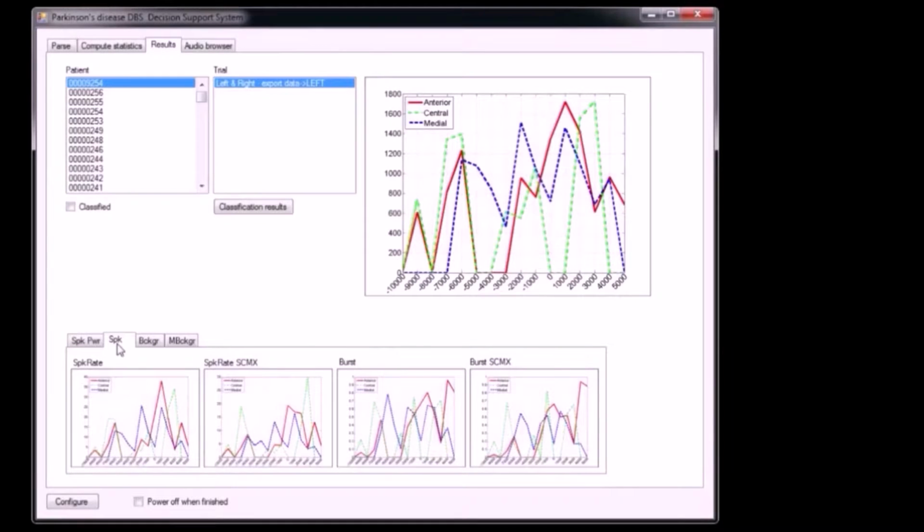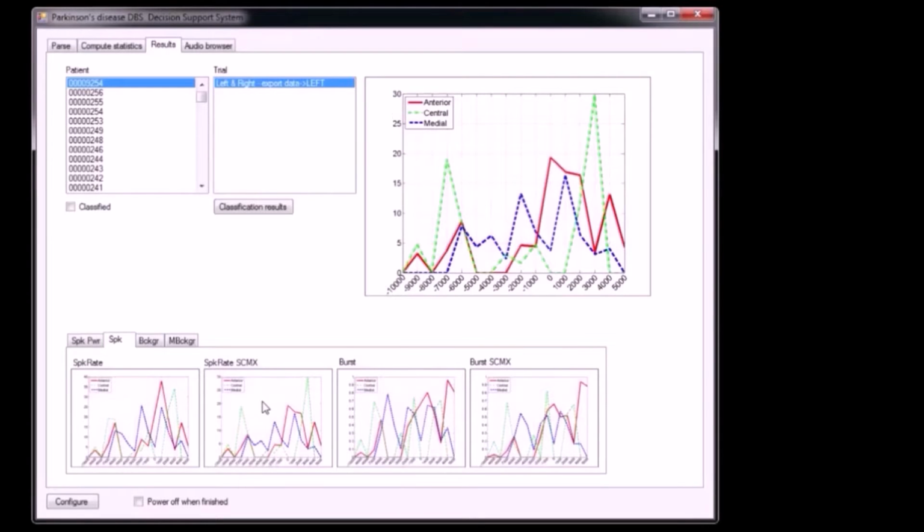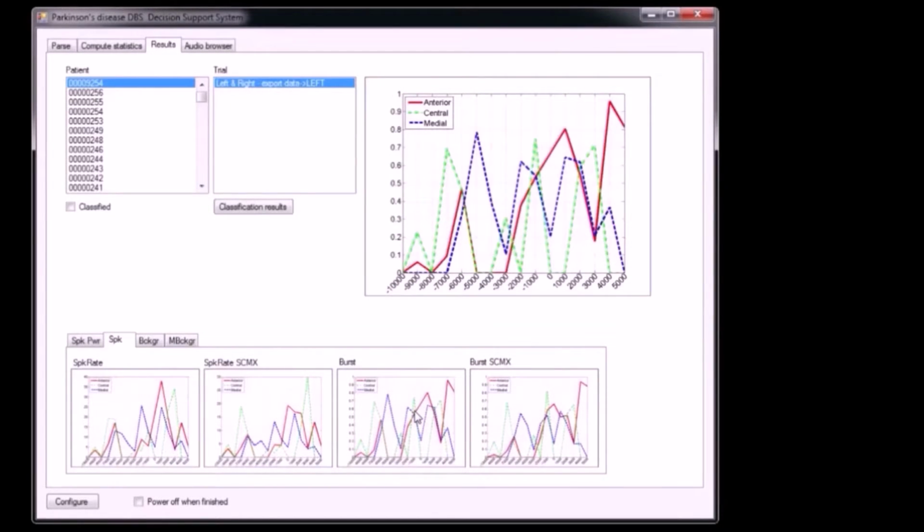2 attributes show the spike occurrences per second. Essentially, this means how many spikes per second on average are found within this recording. This can be shown here for all cells near the electrode or for the best cell near the electrode. As we have stated, it is possible to discriminate whether a given spike belongs to this cell or another cell. In this way, we can treat those cells separately and select the best one. This is for the best cell.